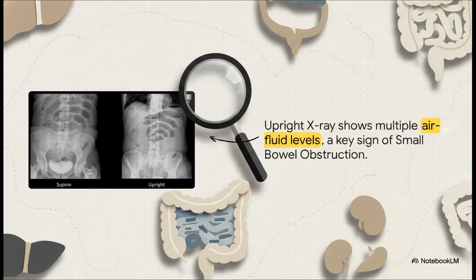If you were thinking small bowel obstruction, then you are absolutely right. Well done. You see those classic step-ladder air fluid levels? That's the big giveaway. So today, our whole goal is to systematically break down how you can spot this and a few other critical findings that you just cannot afford to miss.